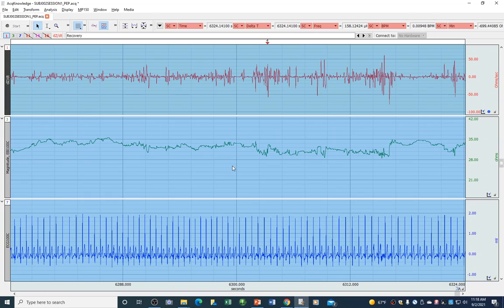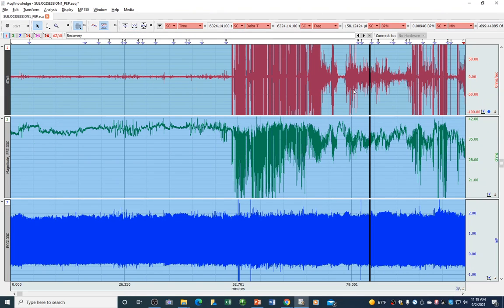Now we're going to go back into our DZDT signal. What we want to do is zoom out to see the whole file as it came in, and that's this button right here. It auto scales a waveform horizontally, which means basically it puts the whole experiment for this day, for this subject, in one view. So it's a way zoomed out view on the time scale.